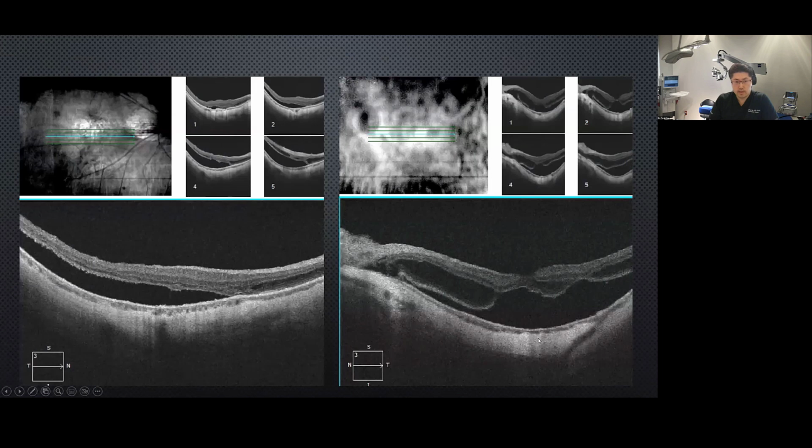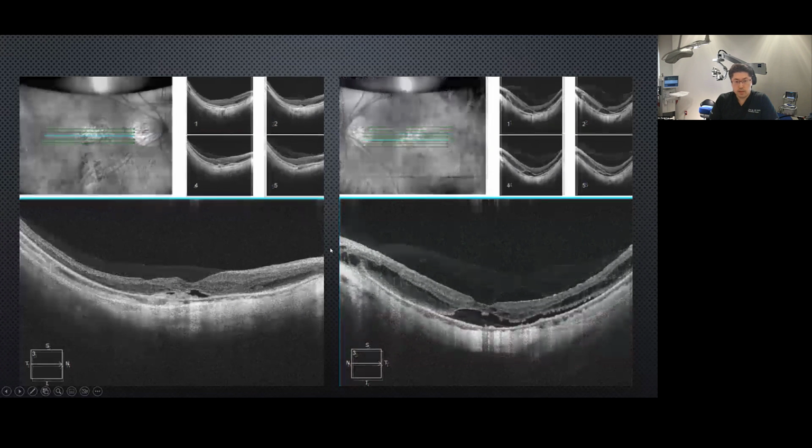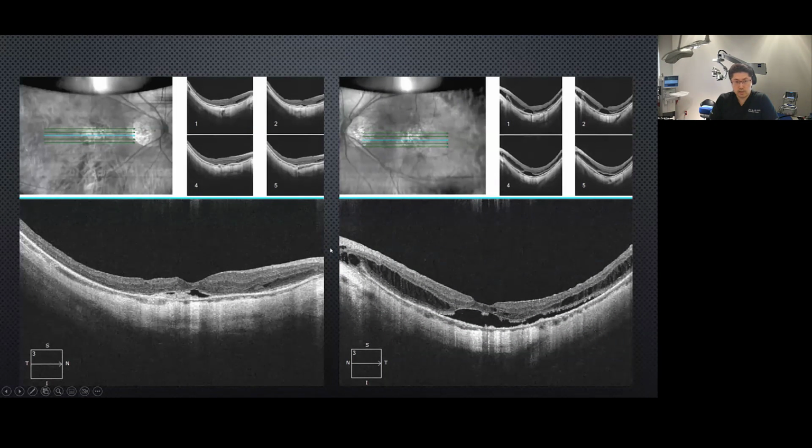So this patient underwent bilateral vitrectomy with a limiting membrane peel from edge of the staphyloma to edge of staphyloma in these cases of myopia patients. And you can see, what we discussed previously, on the fundus picture here, myopic degeneration with RPE loss. After a month post-surgery, there are residual subretinal fluid and schisis, and the patient remains symptomatic. So instead of repeating the surgery, I injected SF6 gas bubble, an expansile gas bubble, and had the patient face down.